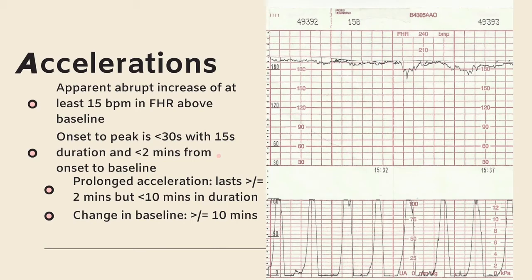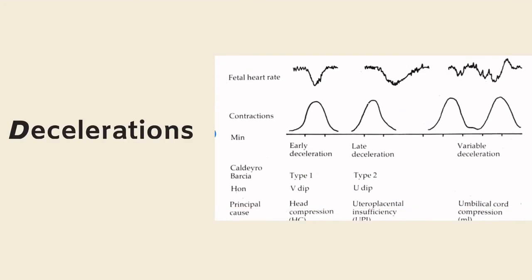For the accelerations, it's the apparent abrupt increase of at least 15 BPM in FHR above baseline. So for this CTG tracing, there's no acceleration identified.